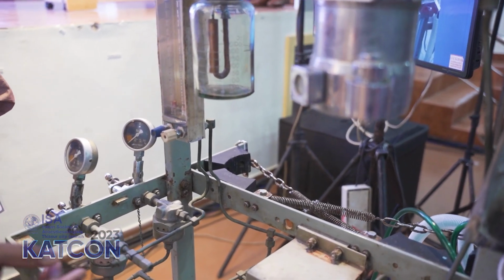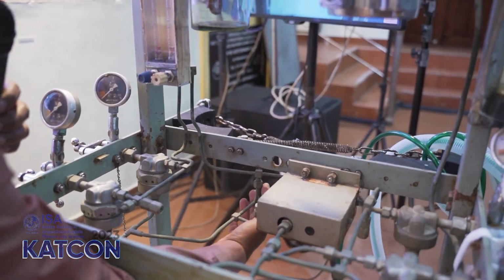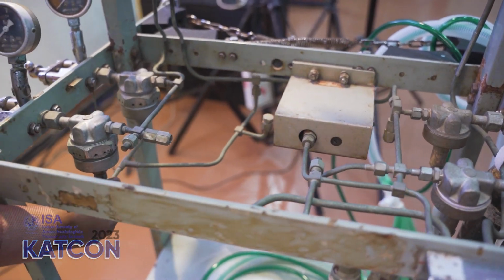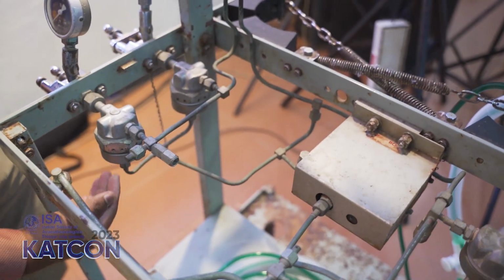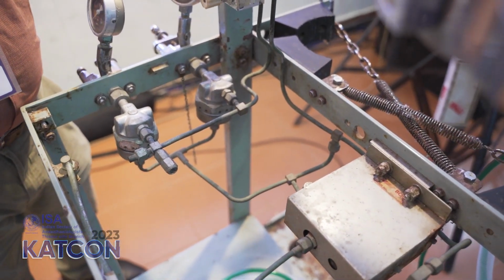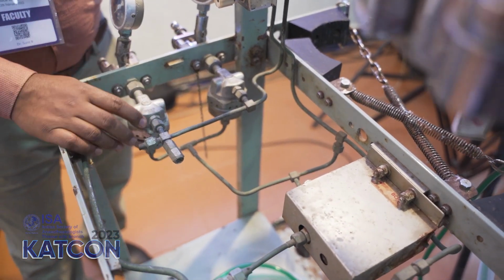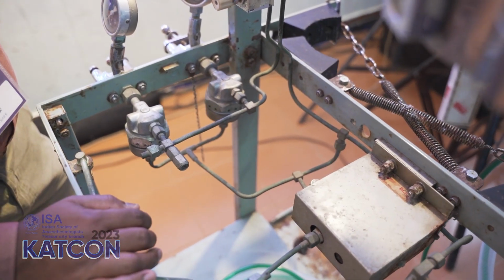And you can see that there is a connection from the oxygen piping of the intermediate pressure system to the nitrous oxide pressure regulator. So this is the master and slave mechanism. When the oxygen pressure falls below 25-30 psi, the nitrous oxide pressure regulator will cut off the nitrous oxide supply to the machine. So it is also called the hypoxic guard or master and slave system.